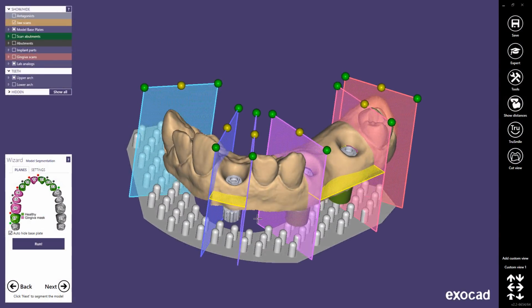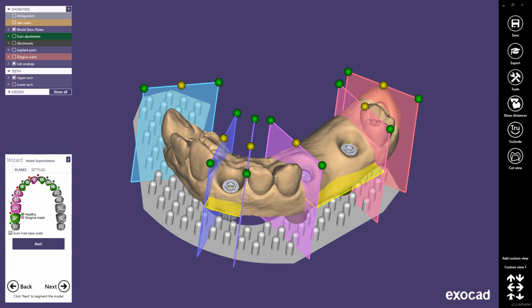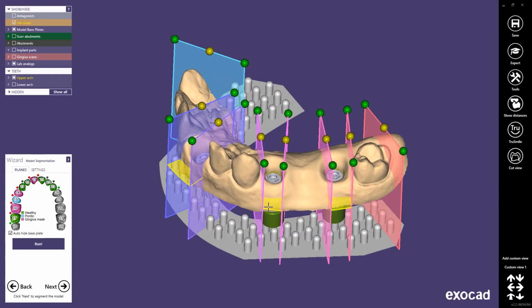The possibility to add gingival masks to designed models is also available for models with a base plate, such as the Baumann EVO system. In this case, it is not necessary to draw the margin for the gingiva. Instead, the software automatically generates a gingival mask for an individual segment of which the respective implant is located. Of course, you can toggle this per implant basis.